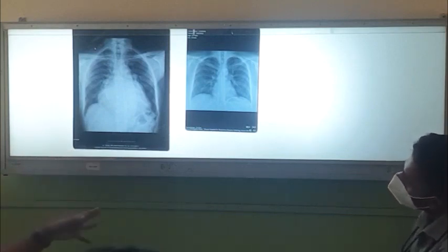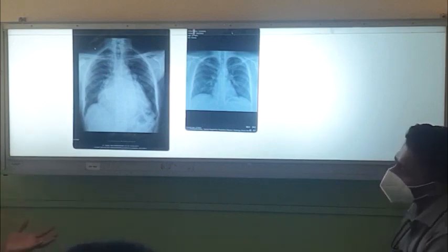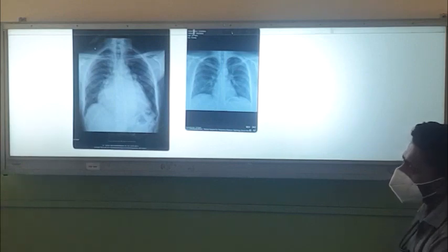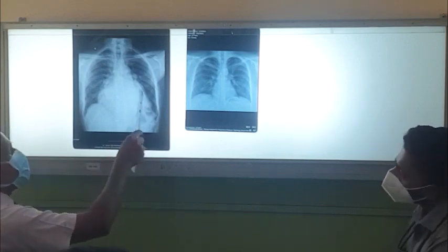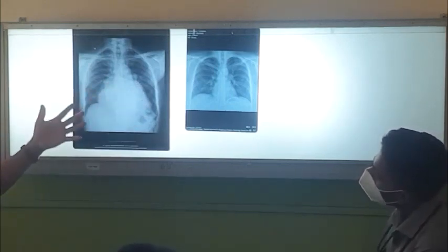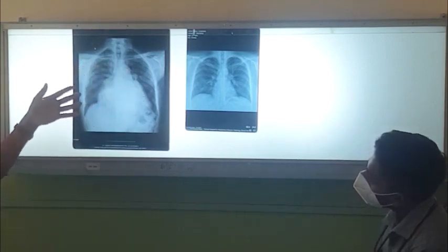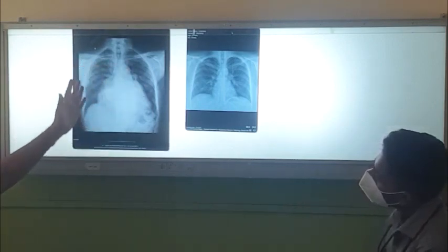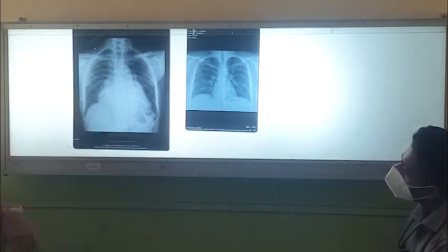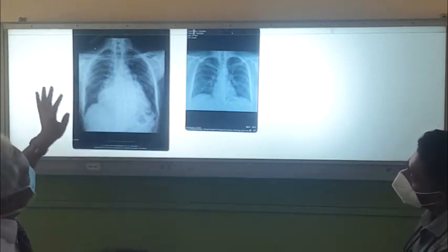When there is severe mitral stenosis, the left atrium gets hypertrophied and dilated, trying to push blood into the left ventricle, and the left ventricle is all right actually here. So this is a dilated left atrium, and then you get congestive cardiac failure, pulmonary hypertension, upward diversion, pulmonary edema, and the right side failure also, right ventricular enlargement and right atrial enlargement also later on. So he has everything.